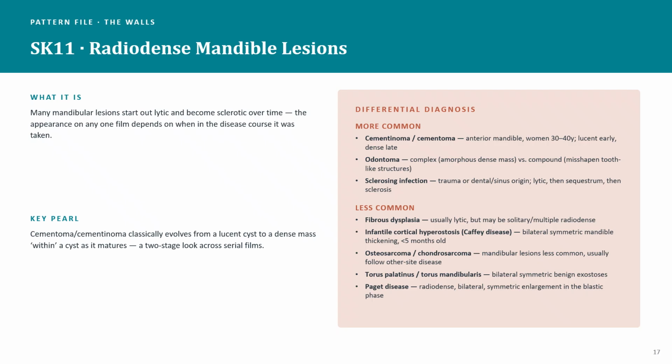So again, we're also going to be looking at the location. We're going to be looking at the appearance and also how the appearance changes over time. And that'll typically help the radiologist or the doctor determine what the overall cause is.